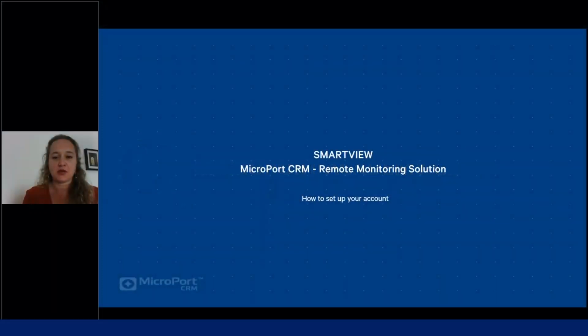Hello, in this video I'm going to guide you through the first step of setting up your account in SmartView and enrolling your first patient. SmartView is the remote monitoring system of MicroPort CRM.